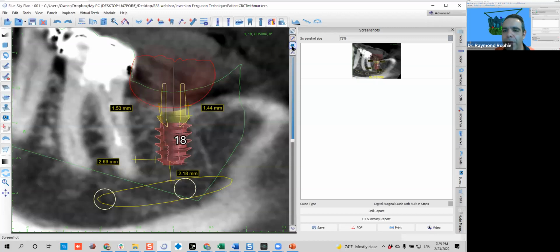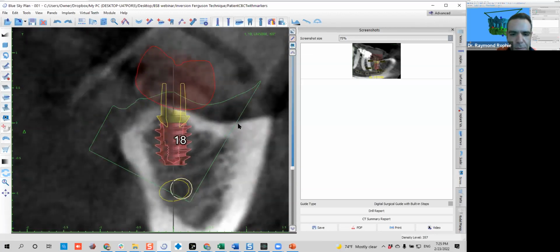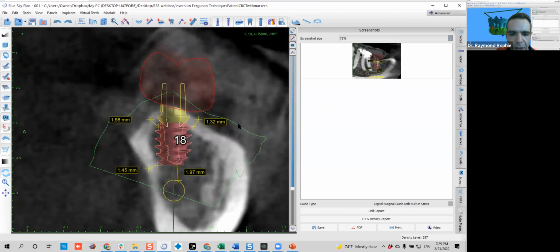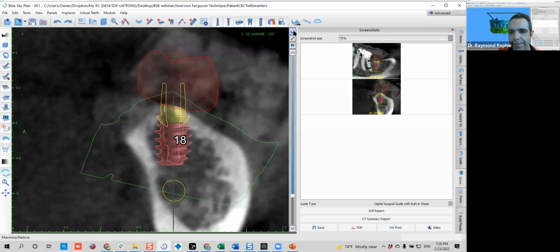So now here, I'll take this picture, I already took it. So now I will need, we already have a mesiodistal view. Now I want a buccal view. So here I have this. Now another screenshot. Perfect. So I have now all the views that I need.